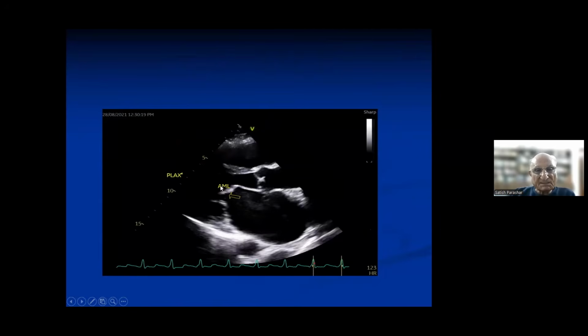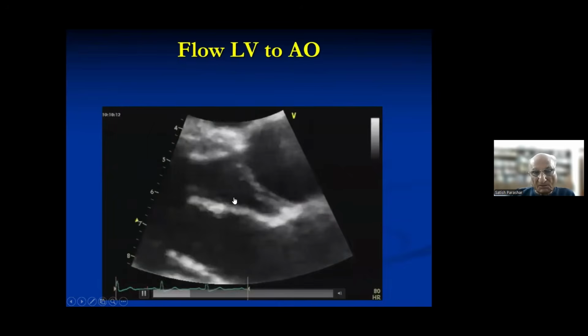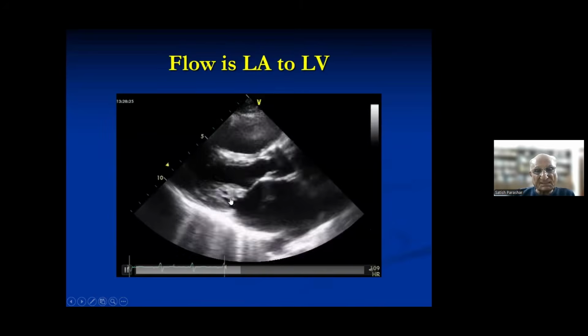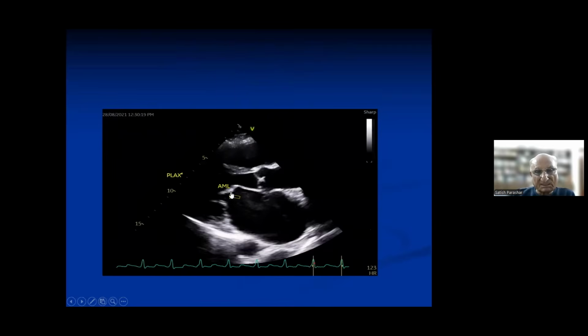This is not a moving image. So you see the doming. The doming is toward the distal chamber. Once you are more expert and you want to measure the thickness, take it at the tip of the leaflet, distally, and measure the thickness there. This is again a doming, a more classical sign, LA to LV, and you see the posterior leaflet moves toward it, but that will be shown again. Now this is shown as a still image. There is just a thickening.